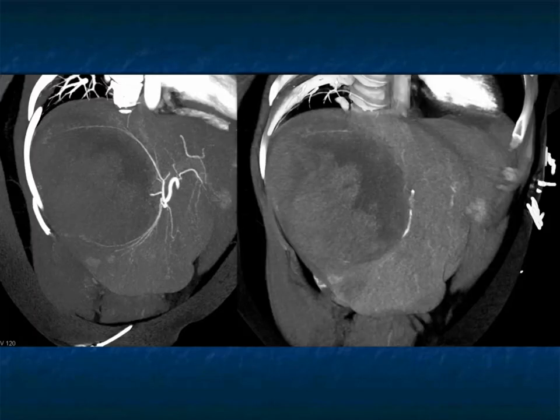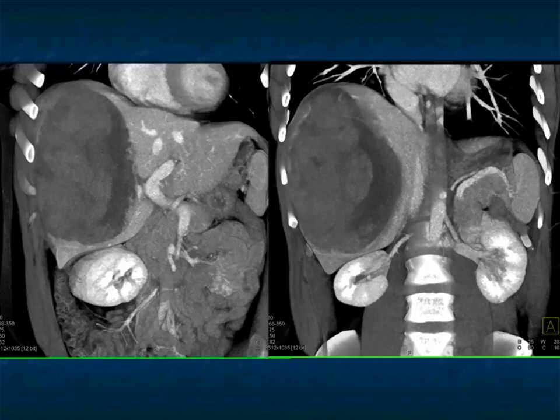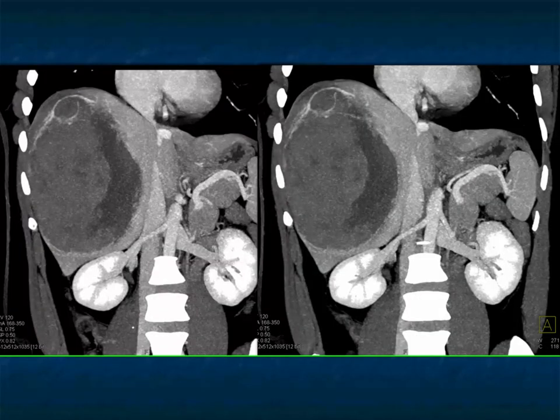You see the stretching of the vessels, but no neovascularity. And this ended up being a hepatic adenoma. Again, there's no way you could say that it was not a hepatoma. But you have to worry about hepatic adenoma just because it's the most common thing to bleed. When CT is not specific, MR is the next logical step. PET has been done, but really is not helpful.